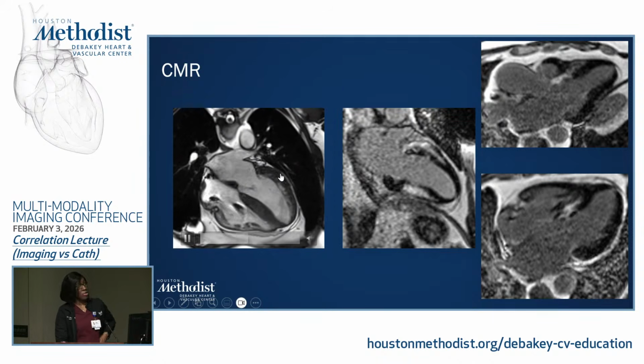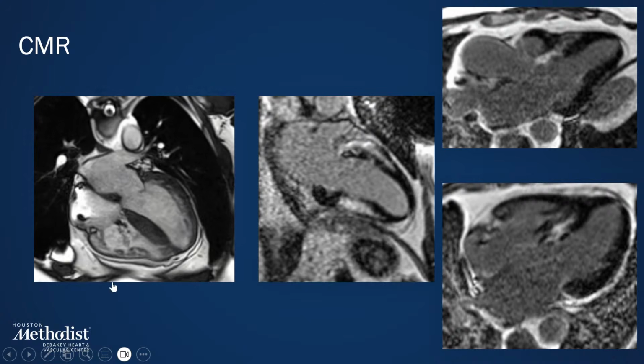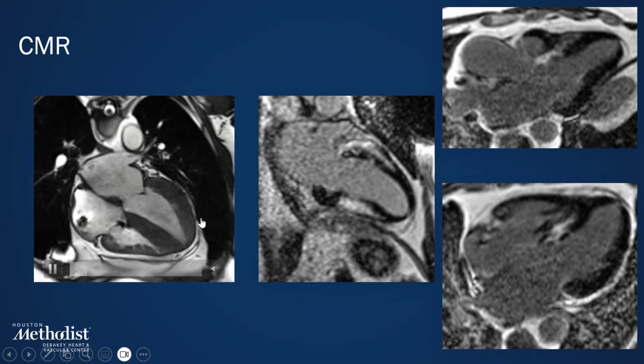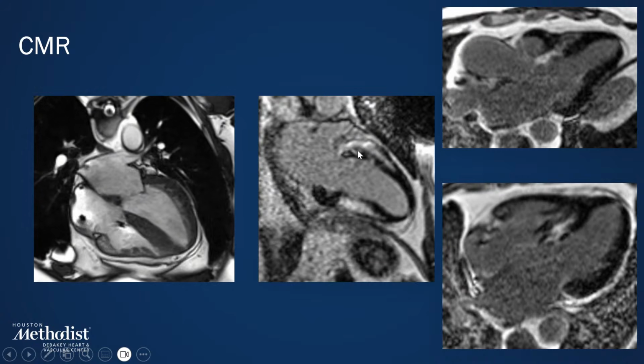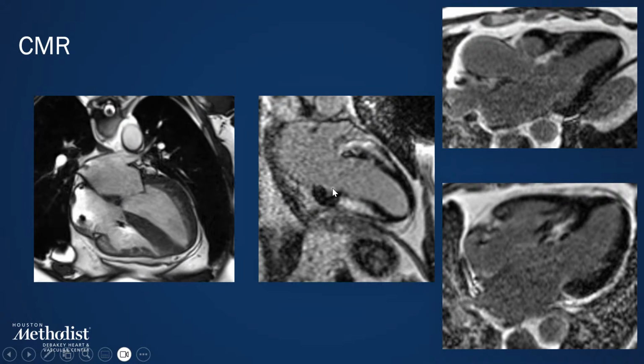He then underwent a cardiac MRI scan here, and we see normal volumes. You can see his intracardiac leads in the right heart, normal volumes, and possibly also a lowish ejection fraction. Ejection fraction on cardiac MRI was reported at 50%. The late gadolinium enhancement images show a dense scar in the anterior and inferior walls. In the anterior wall it is quite distinctly subepicardial, sparing the endocardium, and in the inferior walls it's almost the same pattern, where it's subepicardial and extends well into the mid-myocardial layer but spares the subendocardium, and therefore is a typical non-coronary artery disease pattern.